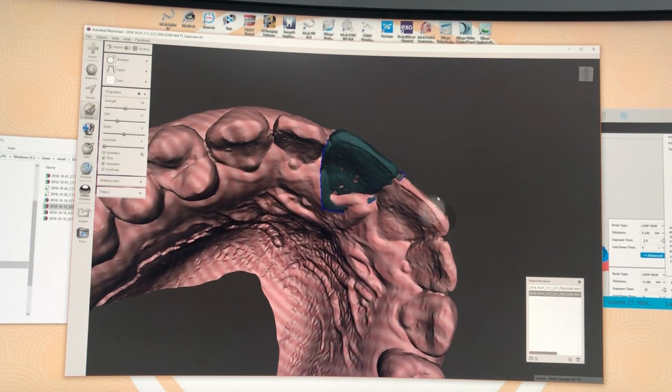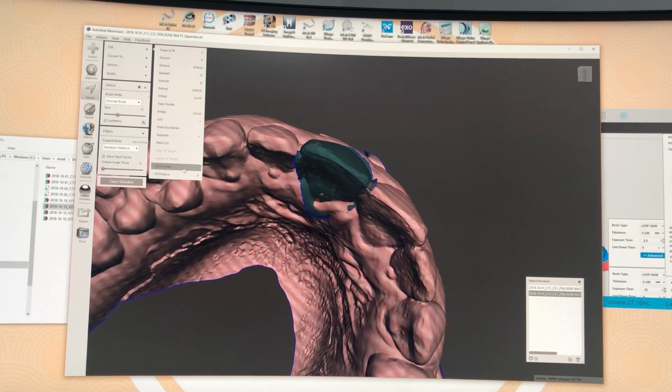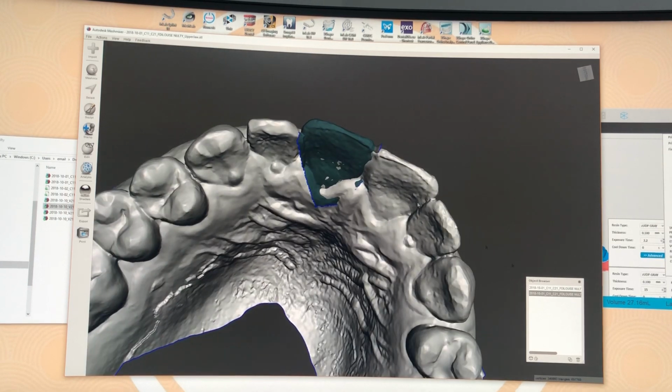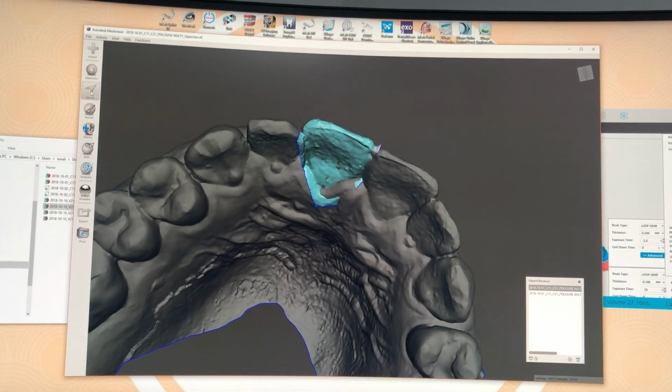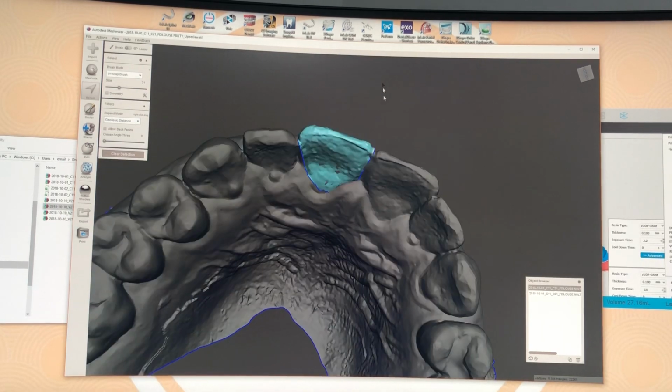Maybe that little bit there needs to get rid of, but we can go on the other object. So we need to select over everything again, Control and A, and Edit, Flip Normals again, and hey presto, back to normal. So we'll click on this object. Let's get rid of these monkey bits here. X, and that's pretty close now.